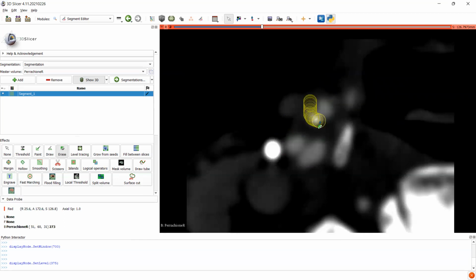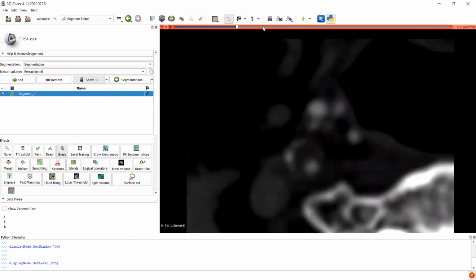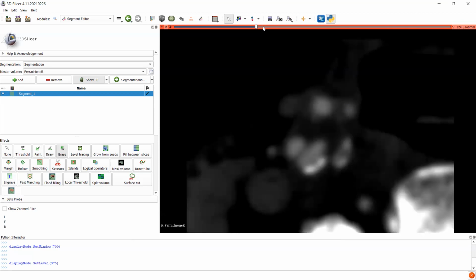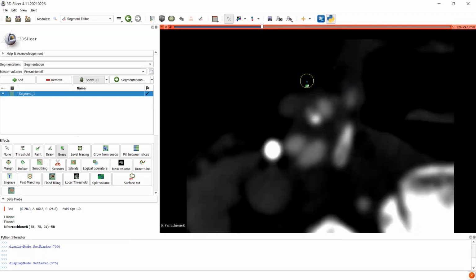And again, you're going to be going slice by slice. Usually there's not too many slices, so going slice by slice won't take you that long. You can see right here, there's actually something very interesting. The way we want to create these geometries, we want to leave just one flow channel at a time in any of the arteries, because if you have two flow channels, they separate and then come back together to form one flow channel. That's going to create a hole, and we can't have a hole.